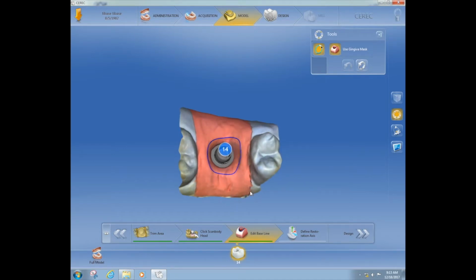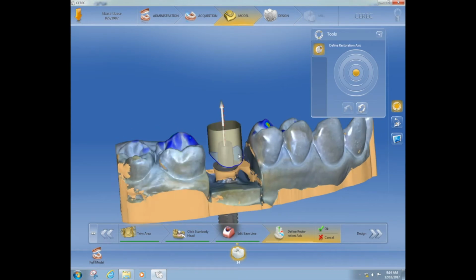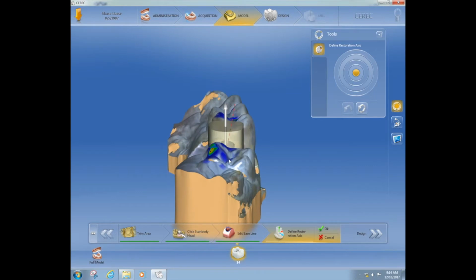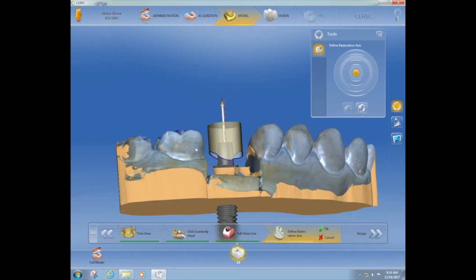We got the tissue moulage superimposed. Let's go ahead and define the axis. Now this really depends on how the implant was placed. The software is showing you what would be straight up and down, and you'll see the dotted line is that implant. So that implant was actually placed a little buccal, probably a little bit too buccal. That's why we want to try to do guided surgery.